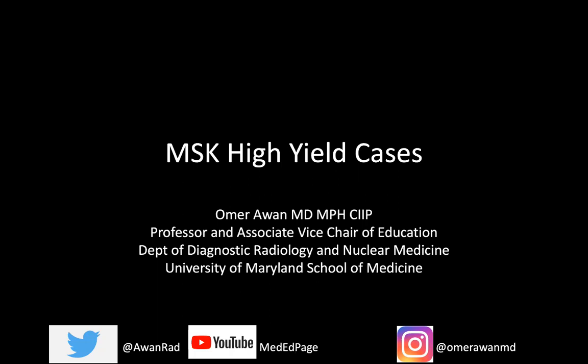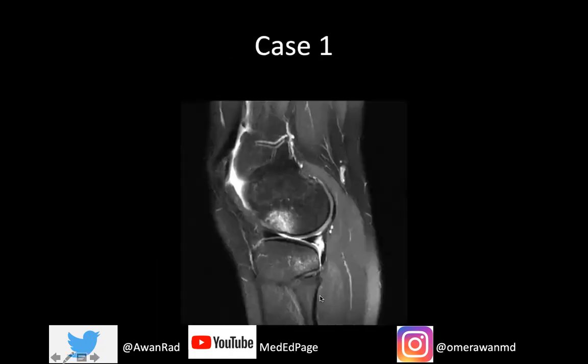I want to do a high yield MSK board review for the ABR core exam. I'm going to show 30 cases with 30 questions, hopefully in under 30 minutes. So let's go ahead and begin. This is case number 1.